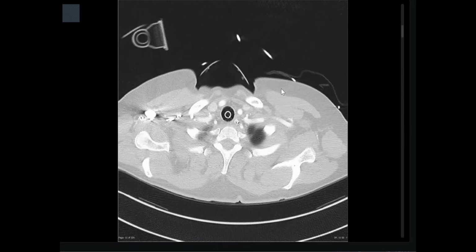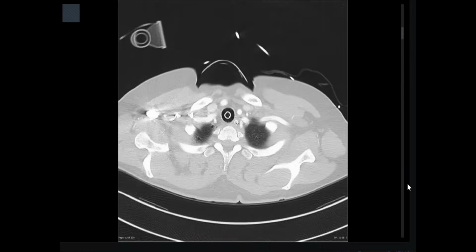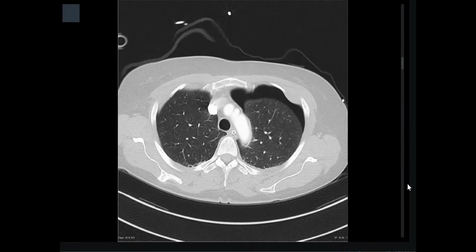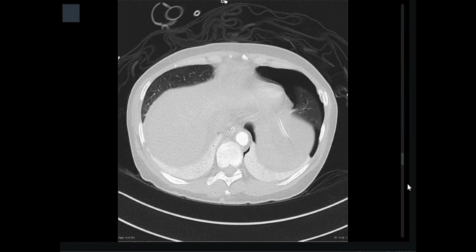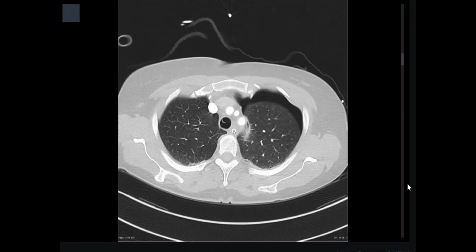Yes, there's a huge, you can scroll from the start. Sorry, I will get a proper mouse for next session. No problem. It's okay. You are doing well. Thank you very much. Okay. So there is a large pneumomediastinum on the left that I can see. Pneumothorax, sorry. No problem.